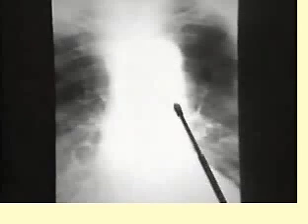Let's look at something else that you may see in the region of the AP window. Here is a convexity sticking out above the level of the left pulmonary artery, which is down at this level in this patient with an arteriosclerotic aorta. What is it? Well, is it a lymph node? No, it's not. Here's a CT scan right through the AP window.